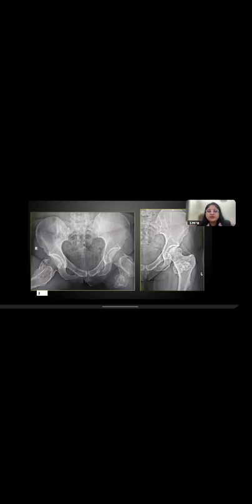And then this radiograph was done. Till now, he did not have any problem with this lesion. However, just by the size of the lesion and growth of the lesion, it is now causing a symptom, and that's why the radiograph was done.